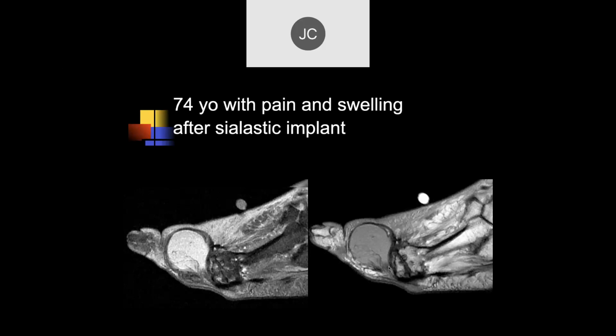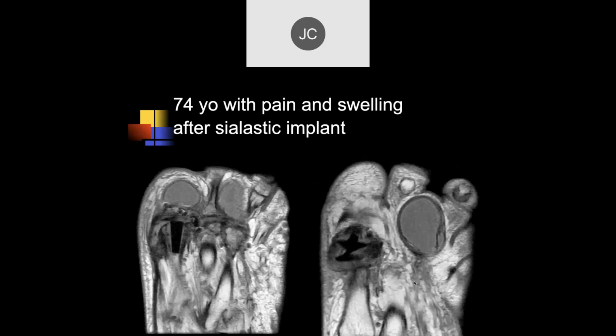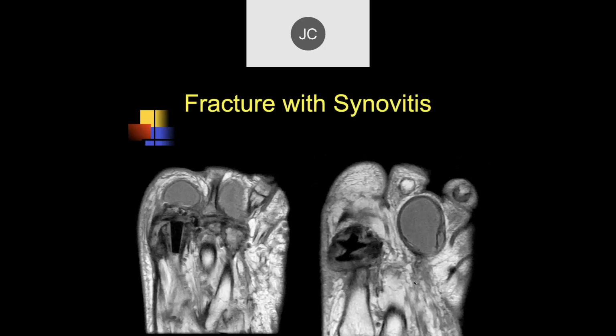So I think John was talking to us about these kinds of implants before. We used to do a lot of these, silicone, but they fell apart, unfortunately, and that's what it looks like. It's a Clayton procedure. What you do is you remove the joints of all the bones, usually in rheumatoid arthritis.